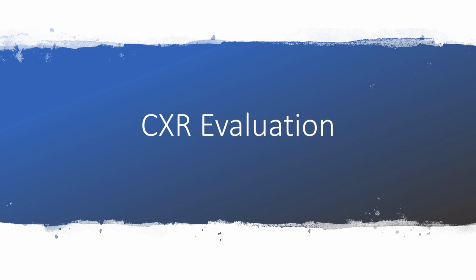Right, welcome to just the basics of chest X-ray evaluation. So this is just sort of my process when I'm going through these. This is not to replace anything that's in the books, like your Wilkins patient assessment book or anything like that on how to read these. This is just sort of me going through X-rays and what I've seen.